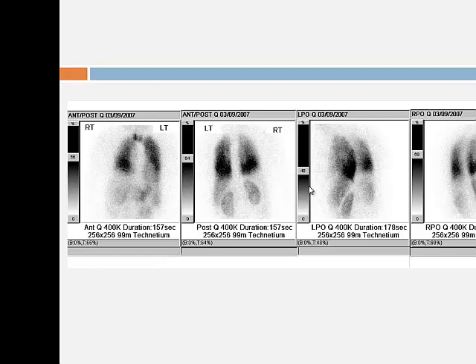Okay, talk to me. How does perfusion work? So you inject it into the vein, it then goes into the lungs and gets filtered out by the lungs, doesn't it? The lungs are a barrier, so nothing should get into the left side. Therefore, why is it getting into the left side? There must be a shunt. So if you see this, you have to start thinking, is there a shunt somewhere? And this may be your first clue on a VQ.